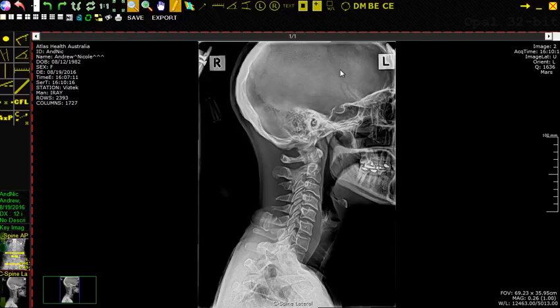Now, the thing that I wanted to mention here, and again, this might be more for the Blair docs, is that when we're doing the stereo analysis, it is easiest when we can get the spine as close as possible to the margins of the view. So as we know, when we're looking at stereo images, we need the right shift on the left side and the left shift on the right side.